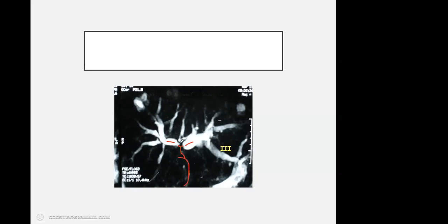So in this whole area, we cannot visualize the biliary ductal confluence and common hepatic duct. We can see a faint mid and distal common bile duct. So there is a lesion at the biliary ductal confluence separating the right and left hepatic duct. So this is the left duct. Again, this is segment 3, this is segment 2, and these smaller branches are draining into the proximal left hepatic duct. These are from segment 4. Some of the segment 4 ducts also drain into the proximal right hepatic duct as well.